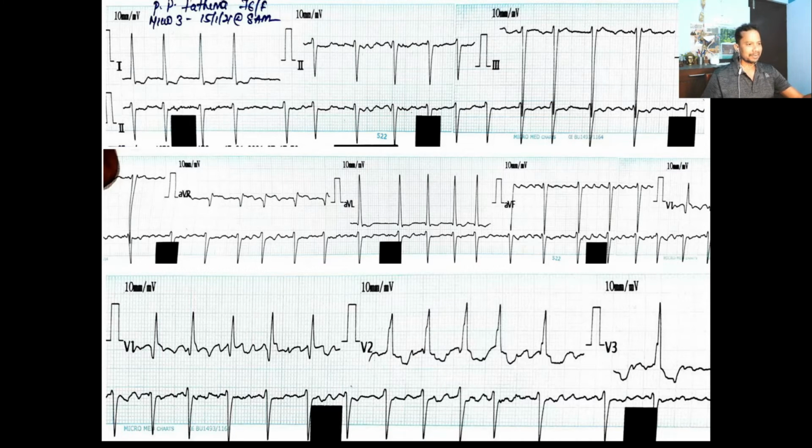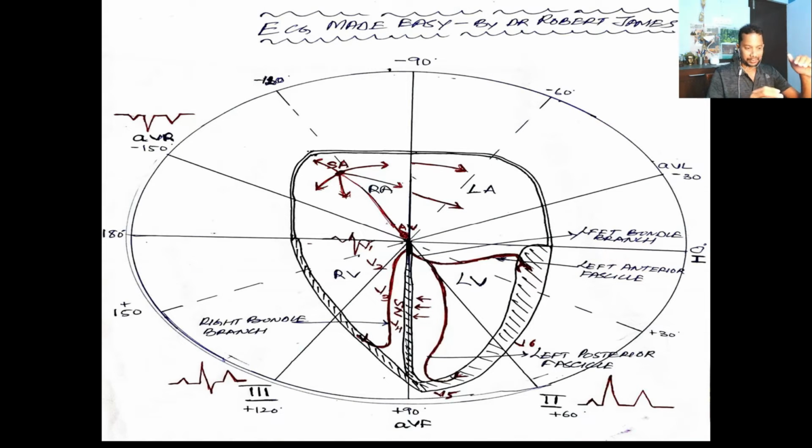It feels great when you find out the axis and detect a lot of abnormalities in the ECG on your own. And you should interpret at least 100 ECGs, and actively you think of this circle. Okay, always, and interpret 100 ECGs and plot them on this circle. You can actually have this printed out and keep it in front of you for at least 100 ECGs. By that time your brain will start mapping all the findings on this circle whenever you will be holding an ECG.